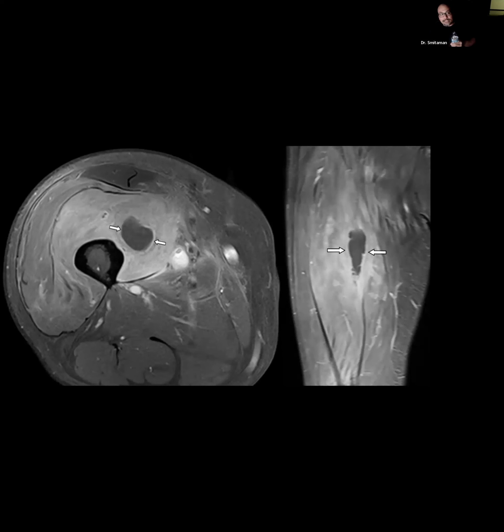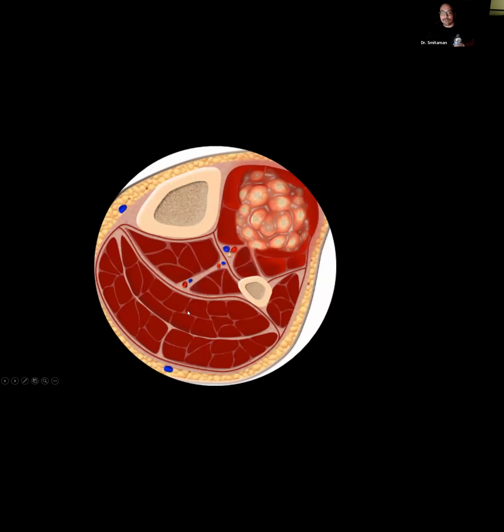Here, this is basically dead or ischemic muscle, infected muscle, right? And sometimes superinfected muscle, sorry, but this is what you're looking for with the surrounding inflammatory change on these post-contrast images, okay? And again, as I mentioned, it is difficult to differentiate from pyomyositis, and sometimes they'll have that white count or fever, non-specific. If you're asked to biopsy this, you may have to do it under ultrasound or CT just to prove it.